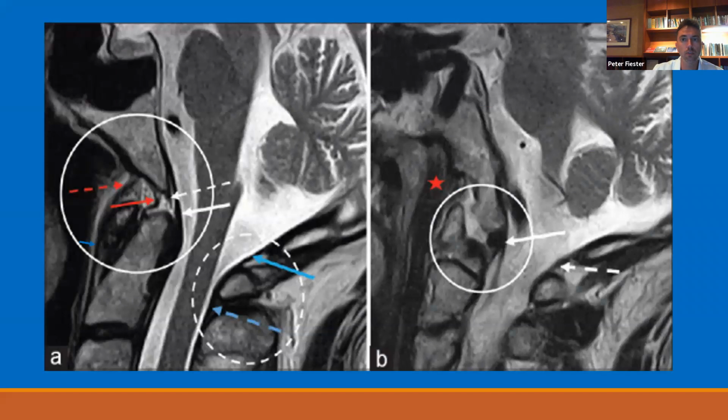So cervical MRI is awesome. I love cervical MRI. I wish we did it more for craniocervical trauma at my hospital. You can see these ligaments, especially in younger patients, so nicely. These are T2 weighted images, and a ligament on a T2 weighted image is going to be nice and black all the way down. So this is your anterior atlanto-occipital membrane. This is your anterior atlanto-axial membrane.